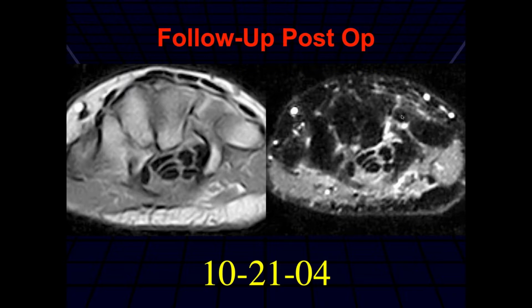Okay, so follow-up post-op. So this one looks like I see kind of a big defect in the flexor retinaculum. Pretty large. The median nerve, if it's there, is very indistinct. I don't really see its borders nicely. So I'm wondering if the median nerve is injured. I don't really see it on these cuts, unless this is just low field. I don't think it was injured, but I think you have some scarring around there.